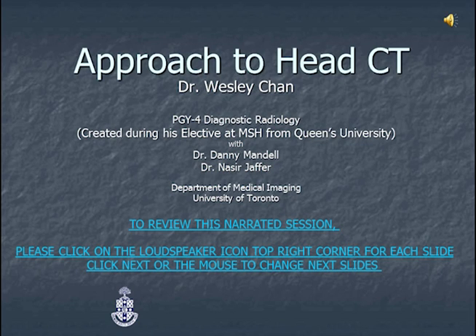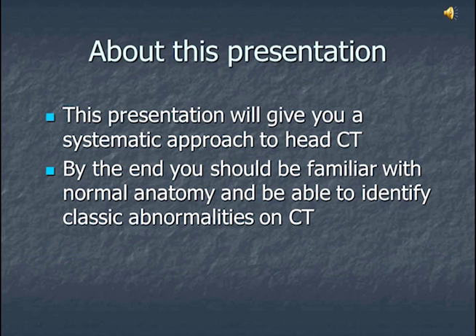Welcome to this module, which will teach you an approach to reading head CT scans. This presentation is designed to teach you a practical and systematic approach to reading head CT scans. Upon completion, you should be familiar with the normal anatomy of the brain and be able to identify classic abnormalities.